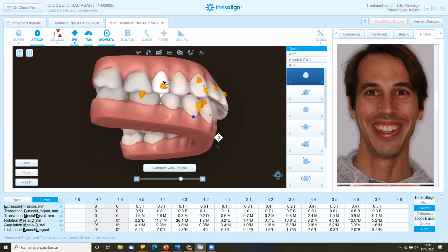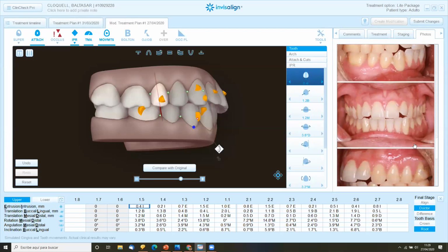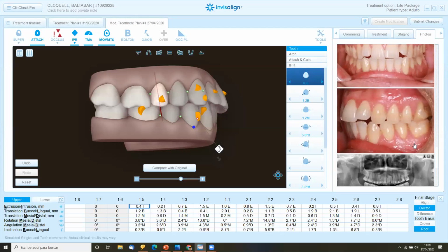And now, in the premolar, look please at the tooth movement table again. The crown, okay, go to the 3rd row, moves 0.3 to the mesial. That is nothing, almost 0. But if you press the root button, you see that the root of the 2nd premolar is moving 1.2 millimeters mesially. Why do we want that? We don't want that. Remember that this is a super common mistake of the Clincheck. It's not the technician, okay? It's the software itself that is making all these mistakes.